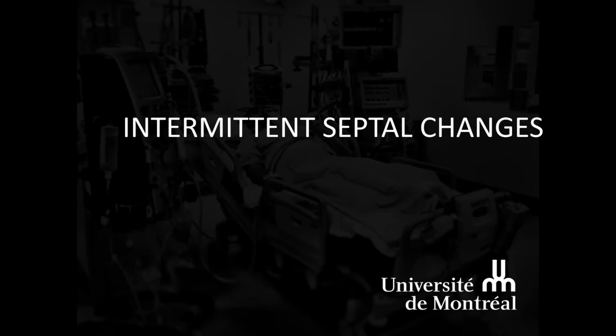This leads us into septal shifts that do not have a persistent, prolonged abnormality throughout a large portion of the cardiac cycle. These tend to have multiple septal movements during the cardiac cycle, often even during a single phase, such as in diastole. This video will not go into important detail as this is more advanced, but it aims to give you some example of the other pathologies.